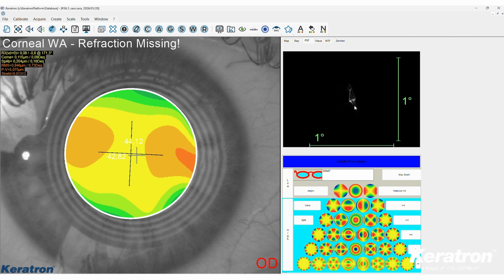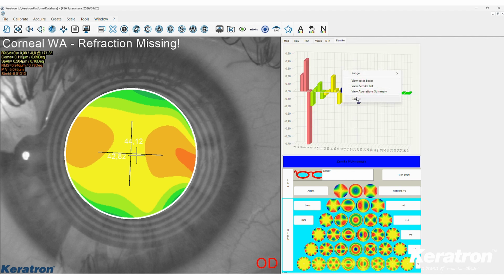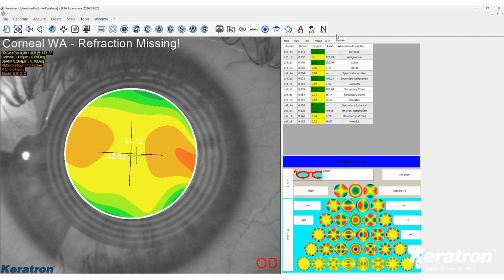Visually, with those aberrations, we can simulate visual acuity, again with those aberrations, and go on to evaluate, also providing a summary, the various low and high order aberrations, always at the corneal level of that eye. It is quite obvious that we are also able to evaluate a significantly different pupil size, which will, as a direct consequence, modify the specific numerical value of the optical aberration.